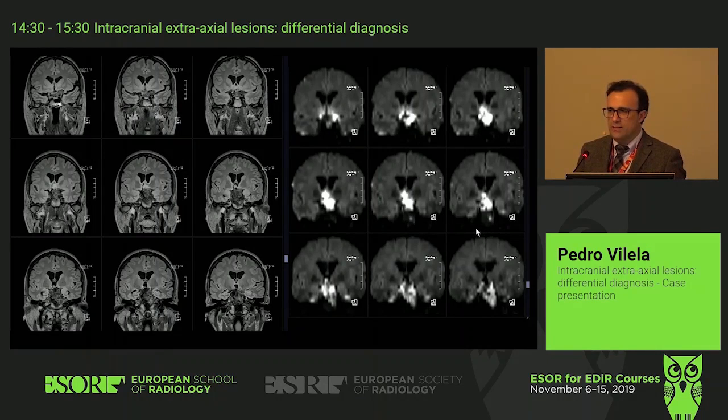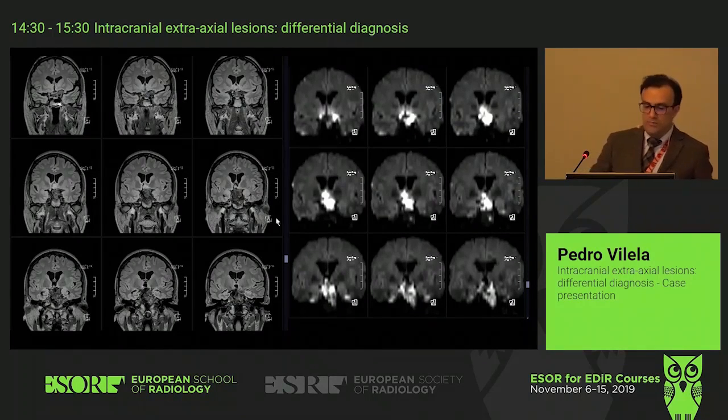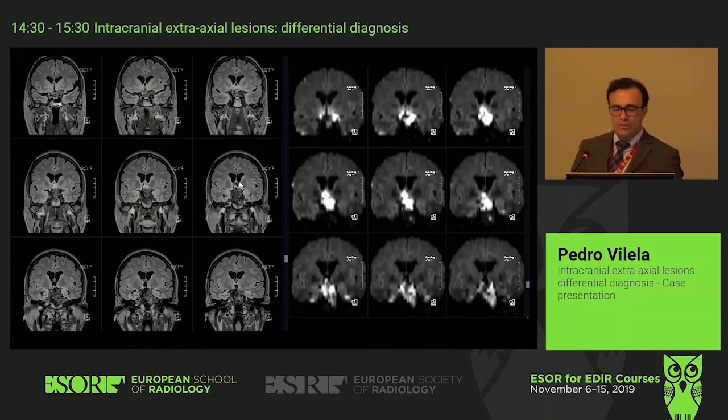So this would be an epidermoid. Very good. The question being, for the surgery, it's important to try to evaluate the full extension of the epidermoid. And so play with the different sequences, because this epidermoid comes from here till here. Where is it? Okay, everything is the epidermoid. Okay, so diffusion and T2 FLAIR are useful also to see the full extension of the lesion.